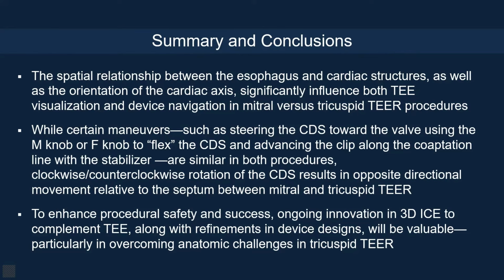clockwise or counterclockwise rotation of the CDS results in opposite direction of movement relative to the septum between mitral and tricuspid TEER procedures. To enhance procedural safety and success, ongoing innovation in 3D ICE to complement TEE, along with refinements in device designs, will be valuable, particularly in overcoming anatomic challenges in tricuspid TEER.